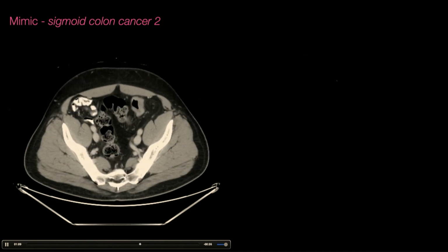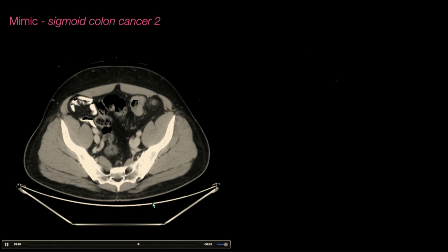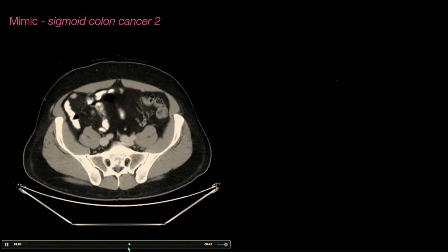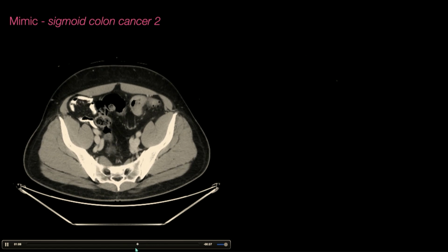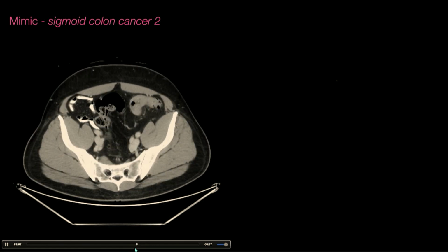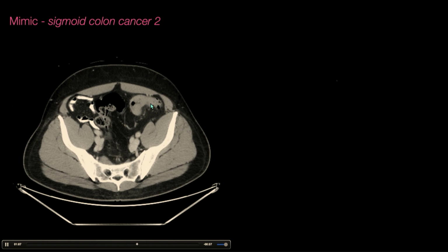And here's one more patient here at distal sigmoid colon with a malignant stricture, and then a couple of those mesocolonic lymph nodes that are maybe a little bit too big to make us a little bit worried, although we could see those in the setting of diverticula. But the thickening of the wall, the absence of a lot of other diverticular disease raises concern for malignancy.